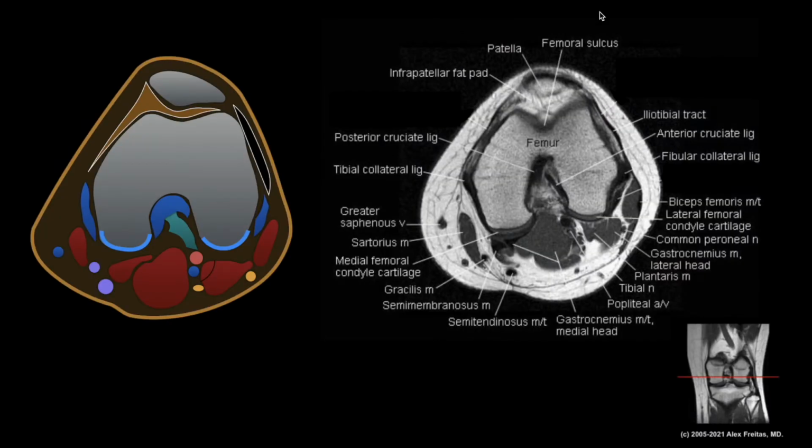Let's move on. So this is the MRI picture. This is not mine. The copyright is written here. So I highly recommend you go to this site and you can see the pictures and everything. You can scroll and see everything. I just want to respect the rights, and I'm going to give all the references and links at the end of this slide.